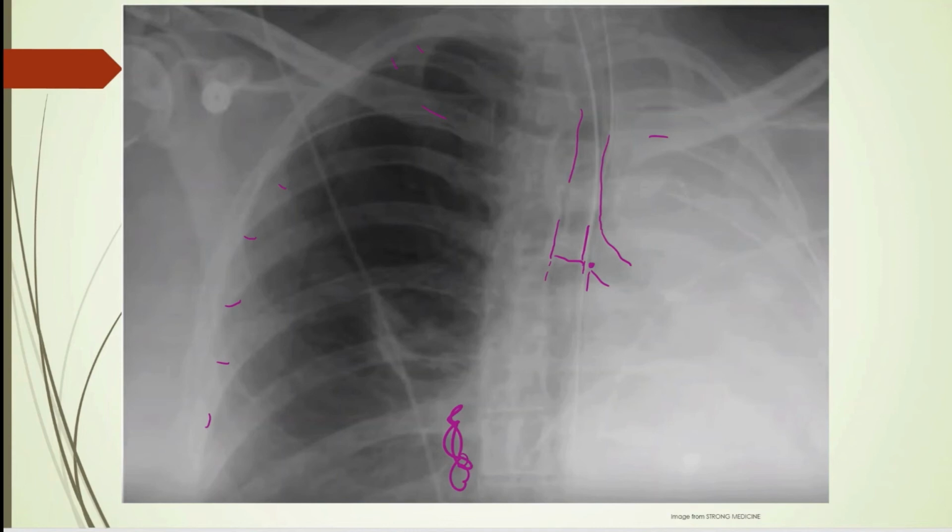And this here also would be where ultrasound would shine, because you could pick this up in seconds as well with an ultrasound instead of having to get a chest x-ray, which takes time, and get it back and get it where you can look at it and so forth. If there's any doubt, you could pop an ultrasound on here and in seconds see that this left lung is not ventilating, the pleura is not sliding, and then you could run through your differential of, well, why not?